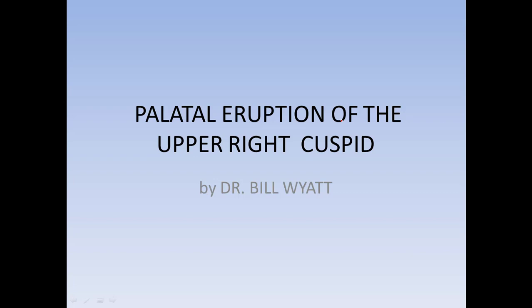This cuspid erupts into the mouth. So anyway, I'm going to discuss this with you just a few minutes. I've got several x-rays on it, but it's a very short video and won't take us very long to do this. So I'm going to go ahead into the pictures on this young man that this happened on.